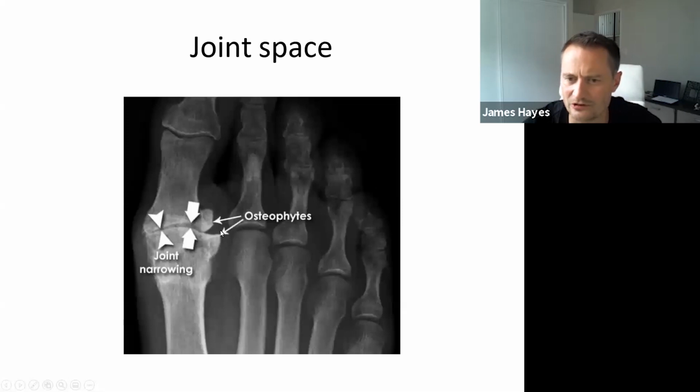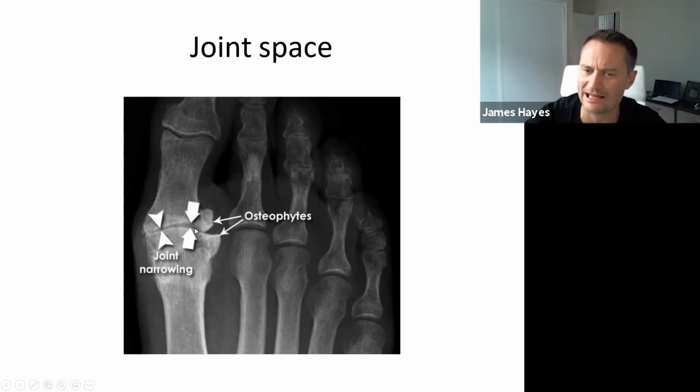In fact, it's got this huge bit of osteophytic lipping over here. And you say, right, well, this whiteness is new bone growth to the point where it started to poke into the soft tissue. This will be badly inflamed in here, and that's what the problem is. So that's what a very arthritic toe looks like. Now, of course, you'll see that in the knee. And the reason I'm showing the foot here is, again, to show what it looks like beside another joint. So you're comparing two similar things, whereas you don't always get both knees x-rayed at the same time.